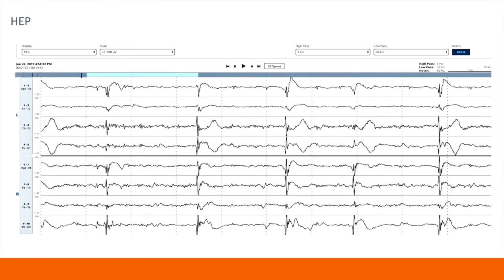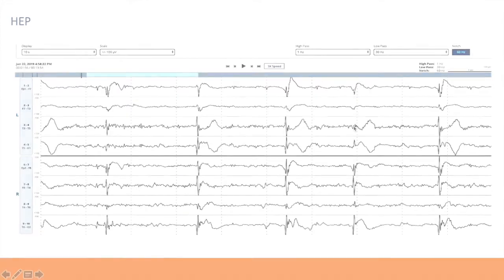This is another case of a highly epileptiform pattern. Epileptologists would call it generalized periodic discharges because the discharges are generalized to both hemispheres and they are again periodic. In this particular patient, listening to both the left and right will generate the sound of a seizure-like phenomenon. The sonification will be a loud scream followed by a flat tone, another loud scream followed by a flat tone.